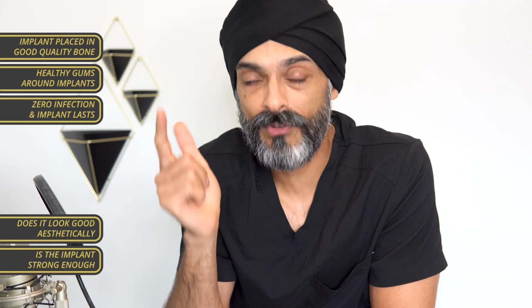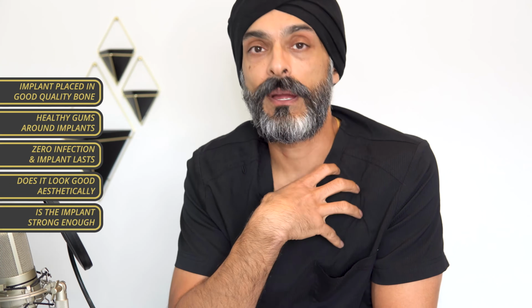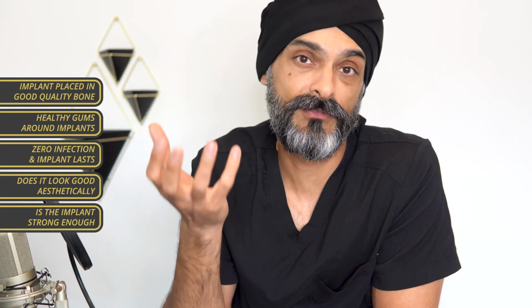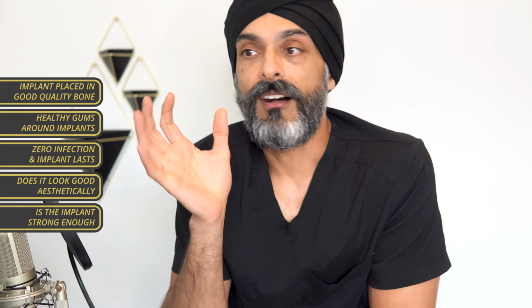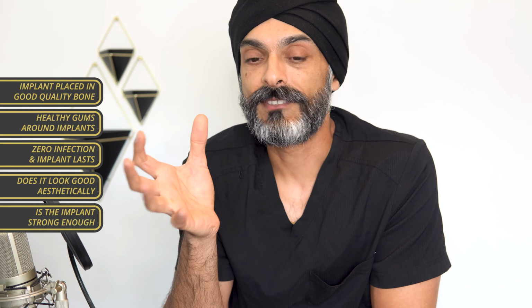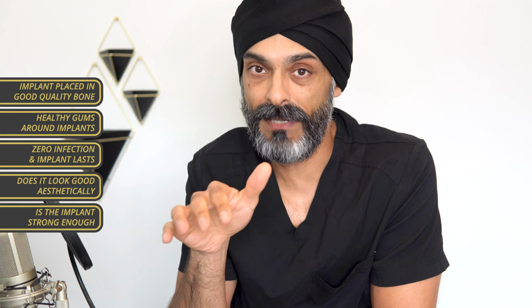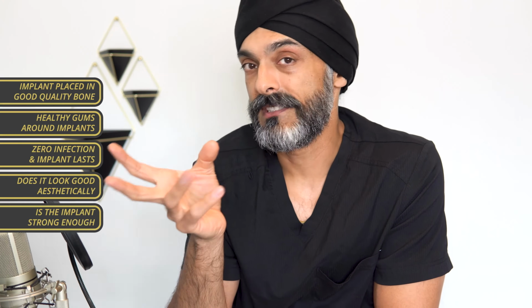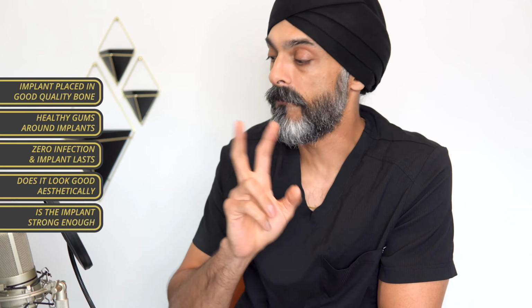Our goal is to make our patients happy, to tick all of the things which they have in their head, what they want to achieve. Our job is to help our patients achieve those goals. And things like, are the implants in good quality bone? That's almost a given. From a patient's point of view, you would completely expect that. So we're going to go behind the scenes. I'm going to show you how we plan for something like that. But first, let's look at the aesthetics.